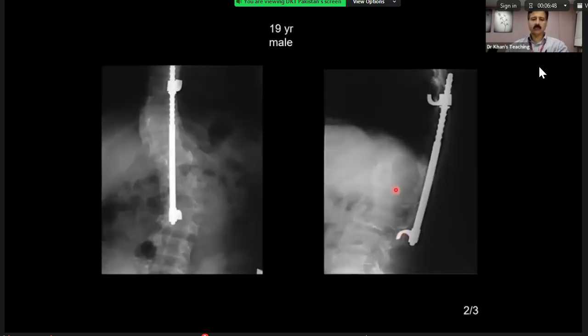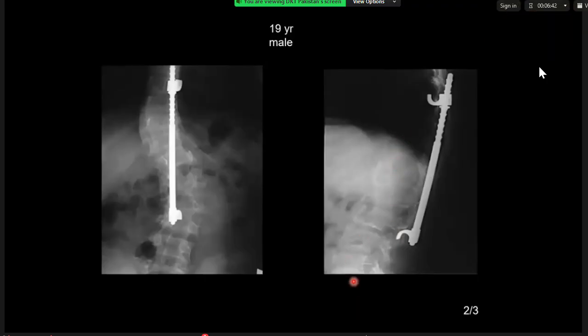What is this? So just on the lateral film, we've got a scoliotic spine with a fixation rod in situ, and there's posterior vertebral scalloping and gross enlargement of the vertebral neural foramen. I think this is consistent with dural ectasia, or possibly a neurally derived tumor causing expansion.